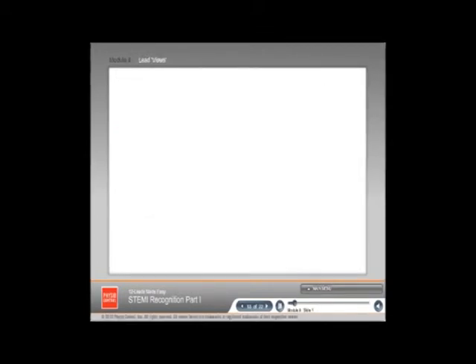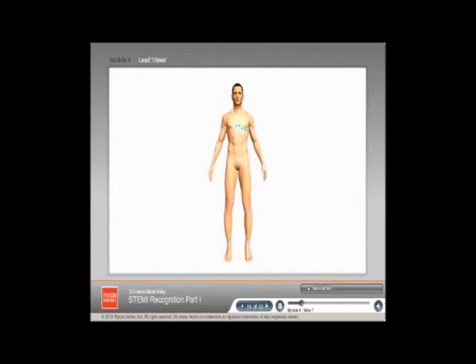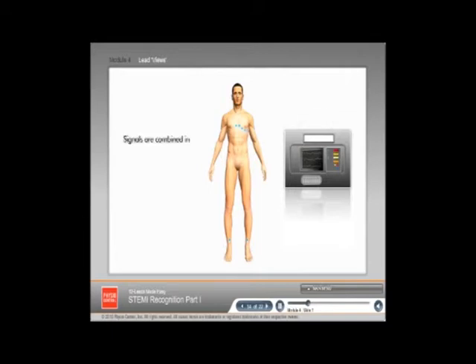Here we are going to learn which part of the heart each lead sees. Take a look at this person. Each of the electrodes are picking up an electrical signal and sending it back to the ECG machine. Those signals are combined in specific ways to form specific leads. There are a lot of differences between leads. For example, some leads have one negative electrode, some have two, others have three. Some look in the frontal plane, while others look in the horizontal plane.